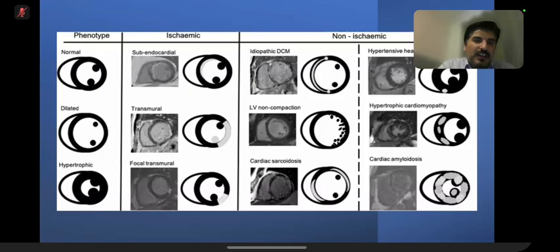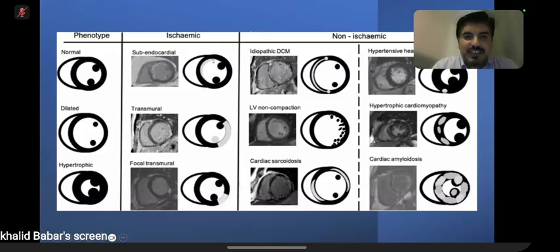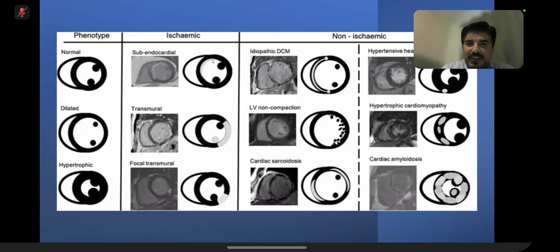Okay. Do you see it is also extending anteriorly as well? This is the anterior portion. Can you see it here? Yes. So we discussed that the anterior portion is involved by the LAD. So this is septal as well as anterior, more anteroseptal, involving subendocardial enhancement. So this is a myocardial MI of the LAD territory.